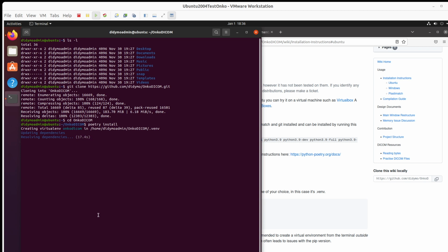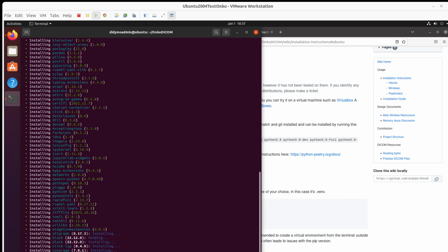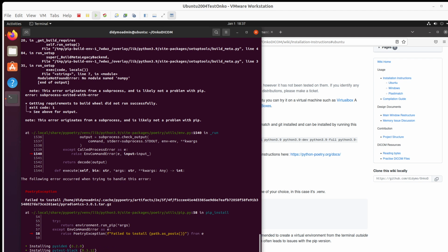However, for the benefit of this video, that error will be left in there so that you can see that you have the same issues that we have. And you can see the issue that we've got there.